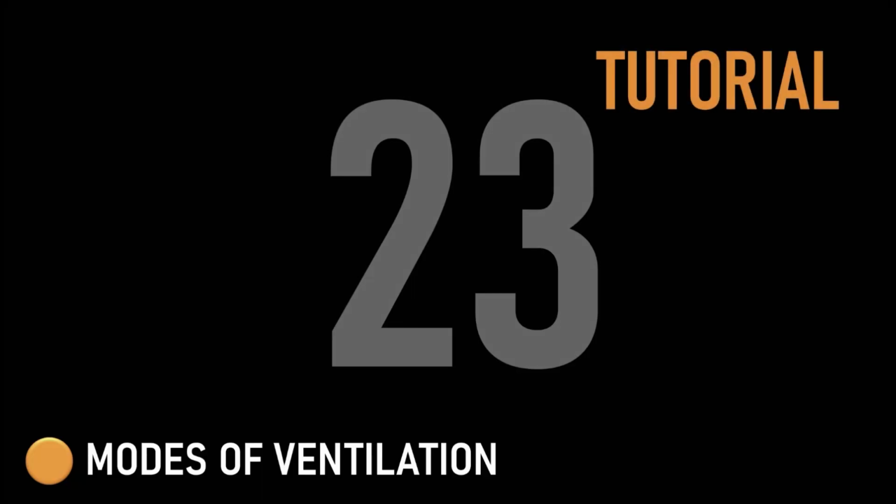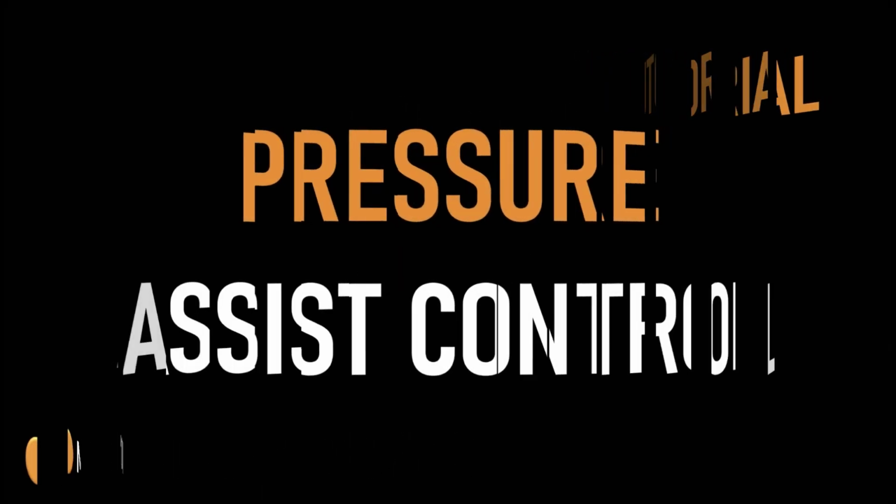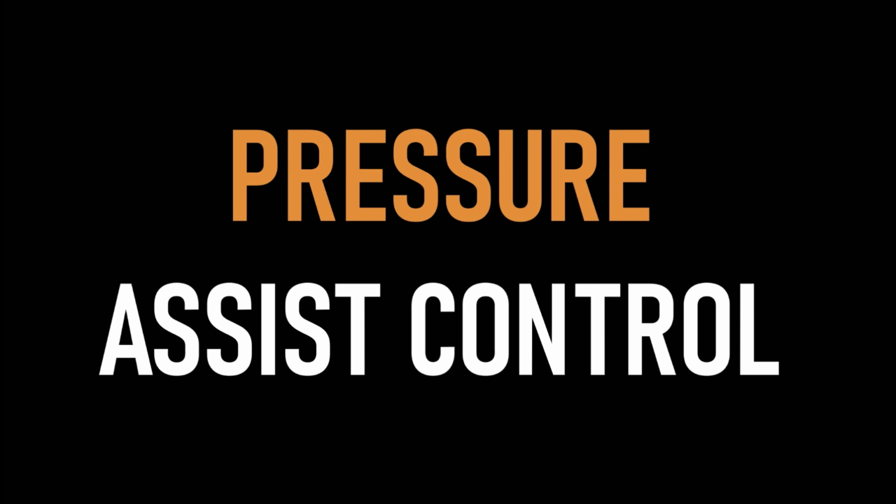It's time to start looking at the various different pressure control modes, and the chairman of the board of all of these, of course, is pressure assist control. It's the original. This is part one of 2 tutorials on pressure assist control where I look at the use of this mode of ventilation in a patient with relatively normal lungs. Tutorial 23, Pressure Assist Control, Part 1.